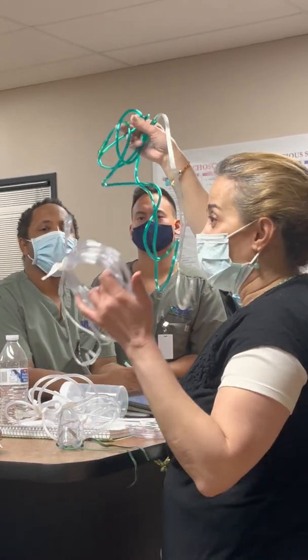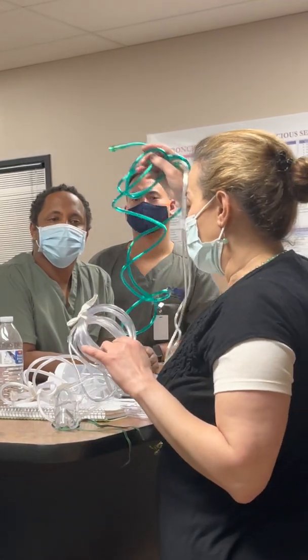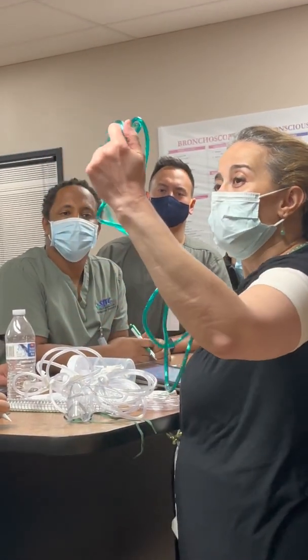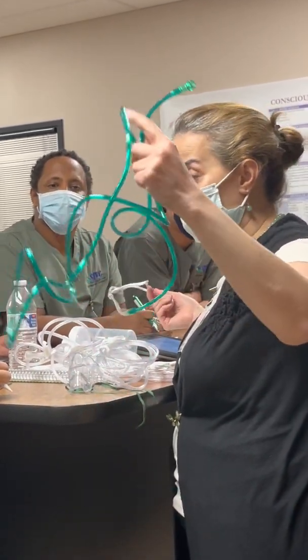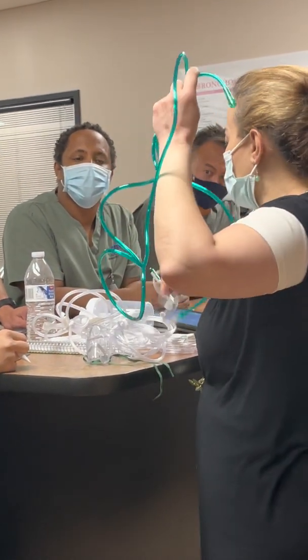I don't go just by the color. It's the flow that makes it high flow, okay? Some people, because I see a lot of our residents, would not let the patient go from, I say, oh, he's still on high flow. No, he's on 2 liter. I just didn't change it to the regular one. So it depends on the flow, the way you chart.